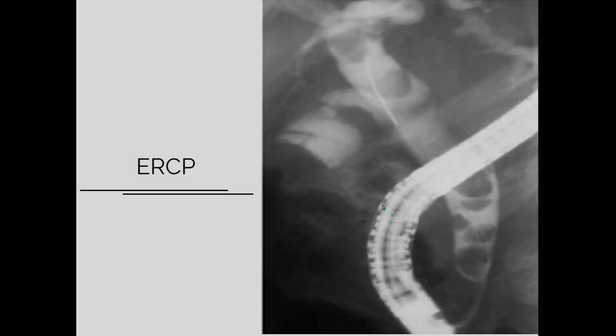Hepatobiliary imaging, in this ERCP, actually I have just written ERCP, you have to write down along with ERCP the full version. Okay. And here, how can you just tell that this is ERCP? Always with the ERCP there will be endoscope present. So this is basically endoscope. So with this you can diagnose that yes, this is ERCP going on.